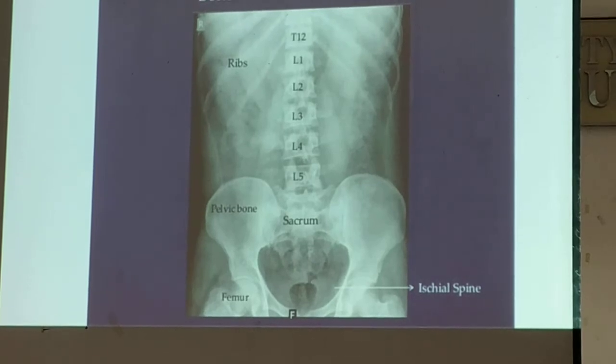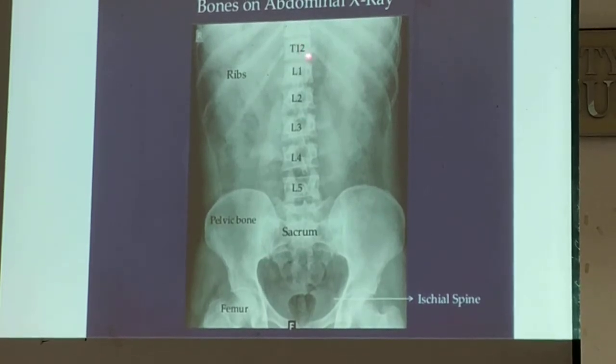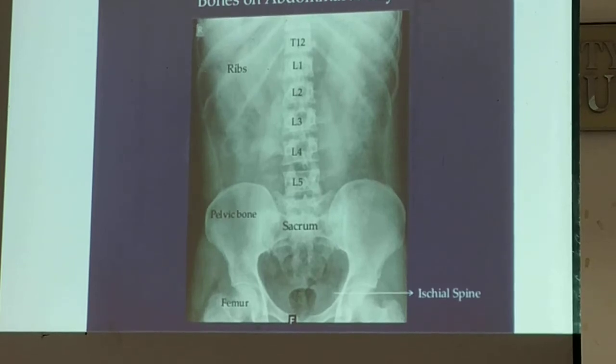So again, another important thing would be that you start counting T12 with your reference of your last rib, because the last rib is always attached to your T12. So 1, 2, 3, 4. The L5 I gave you is not actually well delineated. It is not completely whole, but that is next to L4, so you are obliged to answer that is L5.